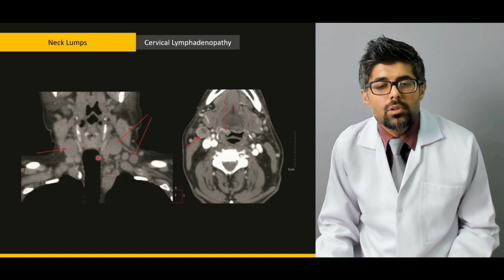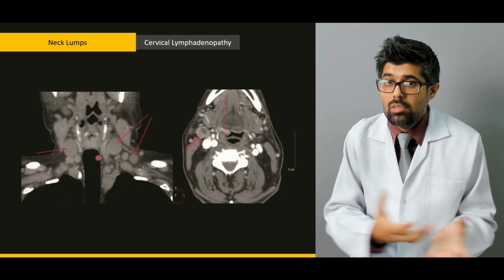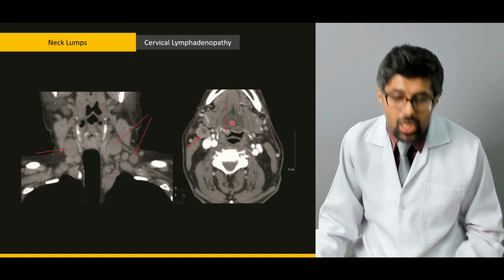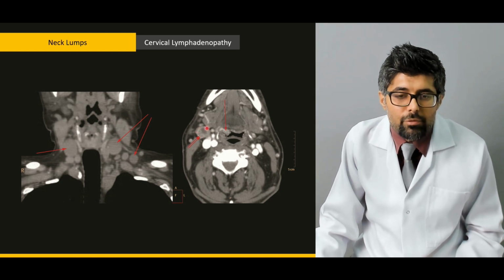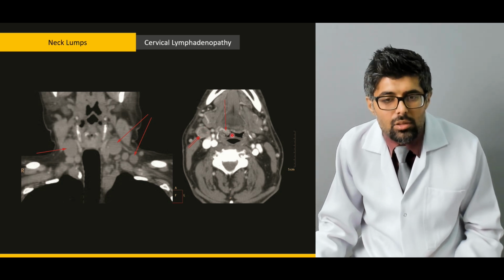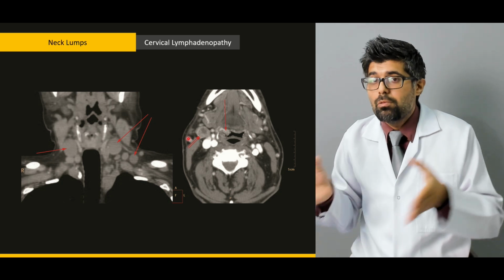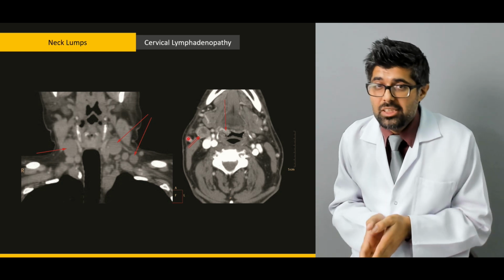One of the examples of lymph node swelling is, like I said before, malignancy or cancer. Here we have squamous cell carcinoma of the tongue, and because of this, on the right side of the patient, the lymph nodes are swollen with a clear necrotic center. So lymph nodes might have a number of indicators for being swelled up, but one of the most common is due to metastasis.